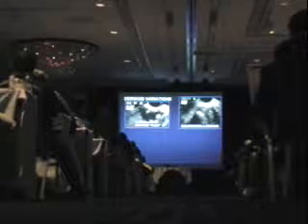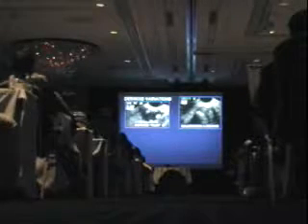What about this? It's very bright, very sharply defined. The shadow is different. It's not that gradual shadowing. What would I expect to see then if I was to take a film? I would see calcification from a bone or a tooth. Looks different. It's much brighter.